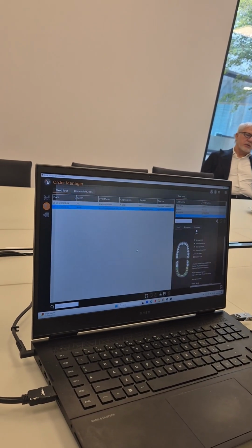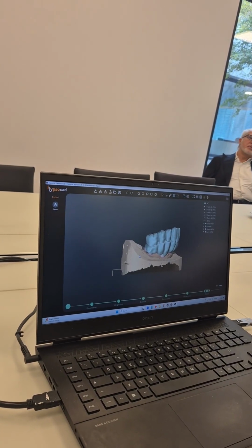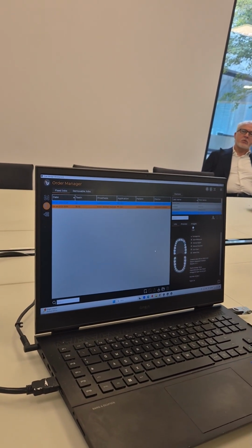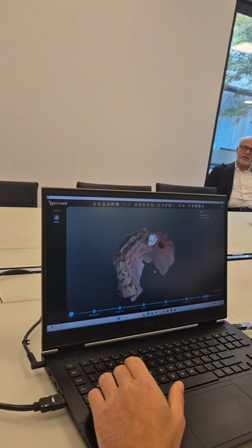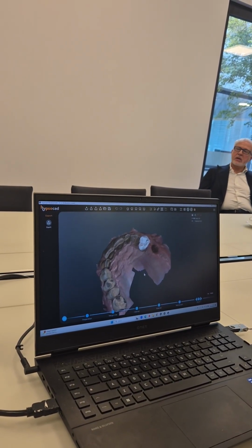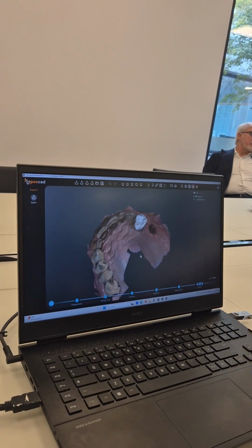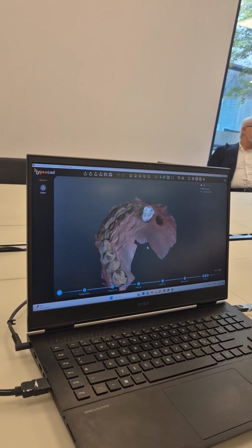Can you show me? If you go back to the positioning, the first one, you can just say go. The chair side, it will be exactly the same. Okay. So it's in development just now. Because I know that you already have all of it, but maybe from a wow effect point of view, to have the possibility to do the finish in one click.